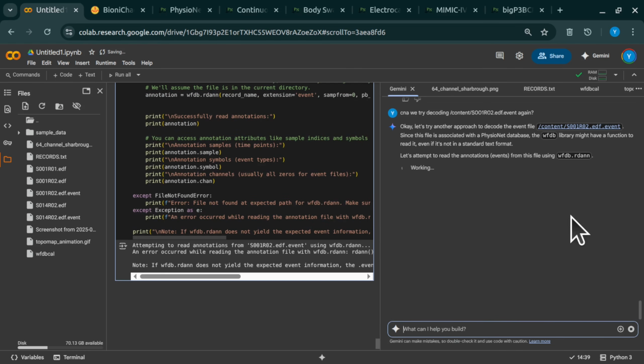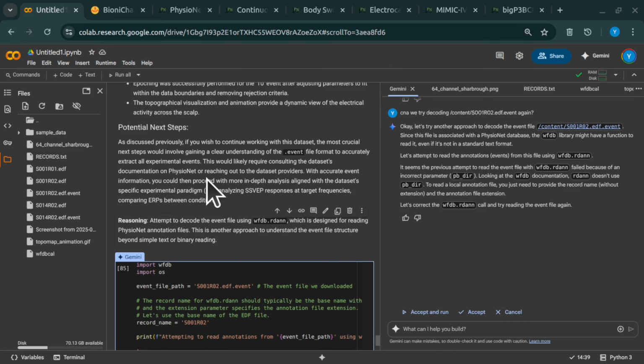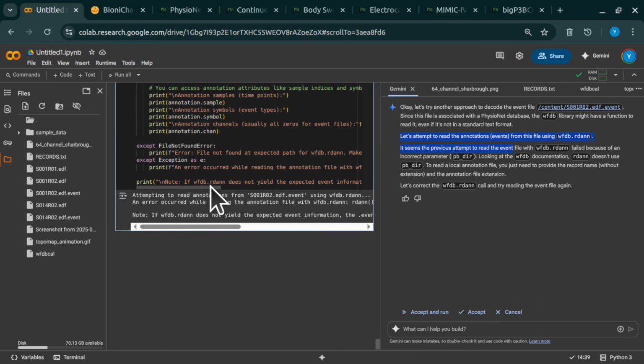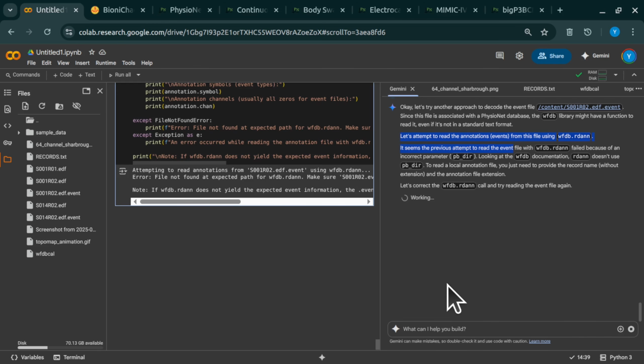Okay, you can run this. So using Colab, Google Colab. It's pretty good. So it's having trouble. It's changing the code. It's having trouble to access the file or something. It shouldn't be a problem.